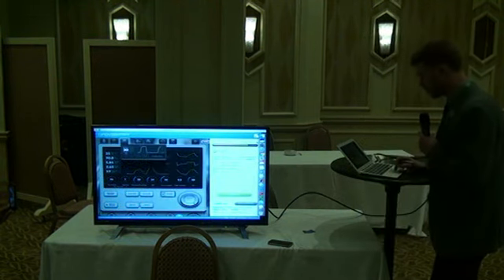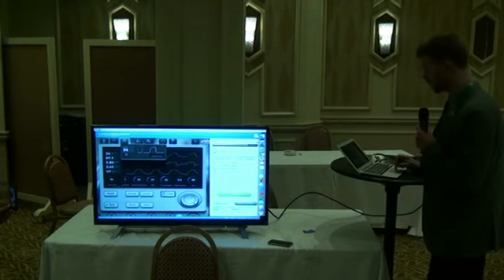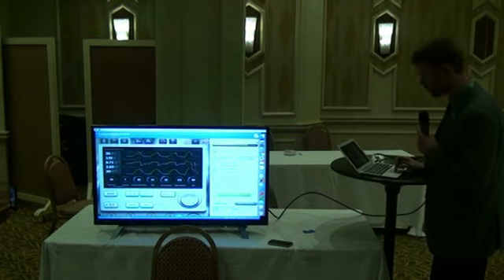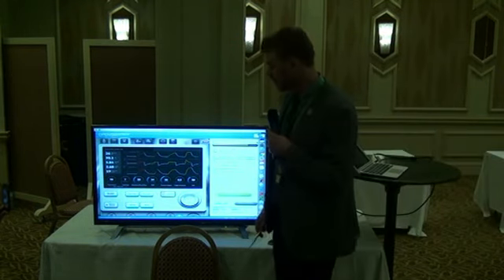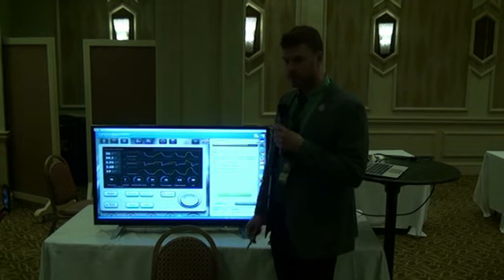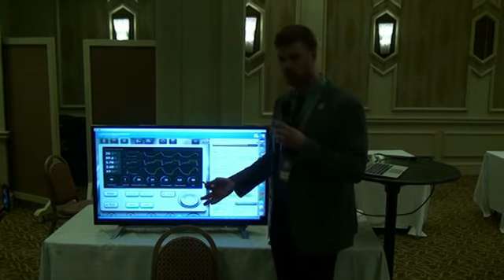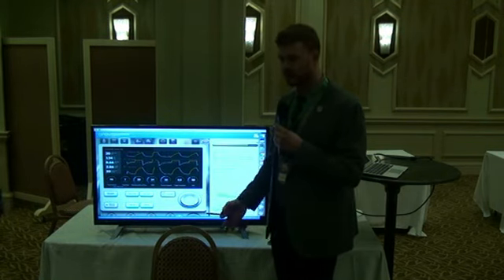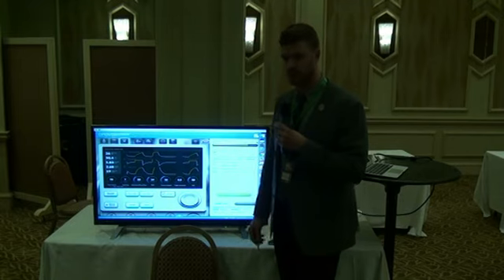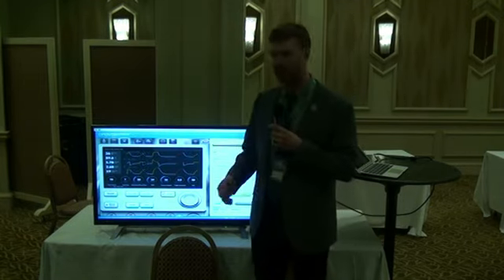Okay, and then we can look at the capnogram. That looks better. Looks a lot more like we would expect. And probably in this case, if we were really treating this patient, or if you had a baby, what would you want to do in this case? Chest tube? Yeah, perhaps. Or alternatively, we could maybe try to tweak down the ventilator settings as much as we can to reduce the risk of pneumothorax or reaccumulation. I think that'd probably be a judgment call and beyond my capacity, up to you guys.